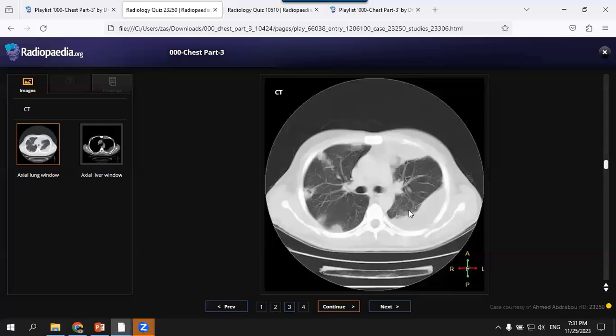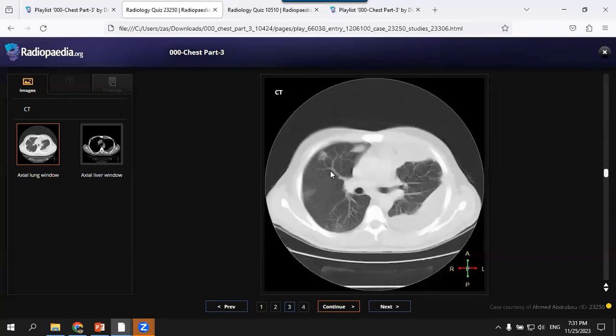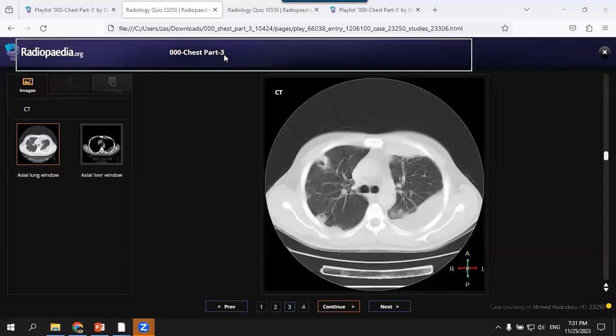Okay, so look through the rest of the scan for any primary tumor, looking at the bone in the bone window, and I will look at the mediastinal window for any lymph nodes. Good. These are mostly related to multiple cavitary metastases with malignant pleural effusion.